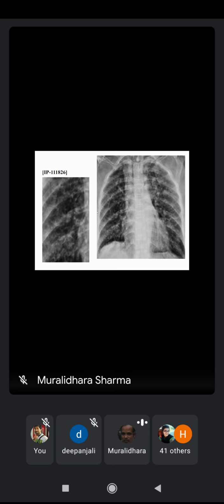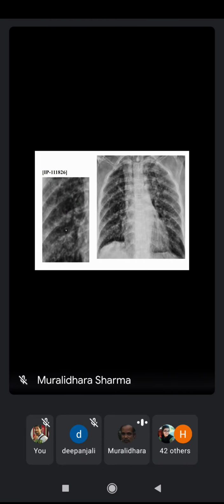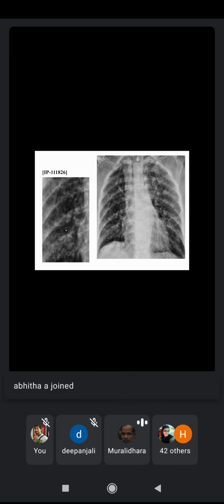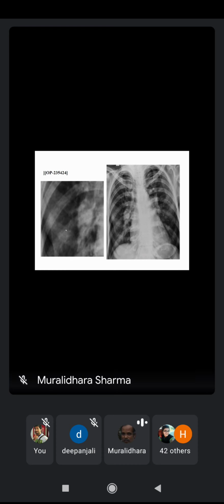But beyond that, if you look at the lung tissue, you can see this dense mottling along with thicker fibrous bands all mixed together. This kind of picture is an advanced interstitial lung disorder, which again doesn't mean a single diagnosis. The cause of the interstitial lung disorder has to be evaluated. Interstitial lung disorder also can present in a fashion where it may not be uniformly involved in the lung tissue. Some areas may be more involved, as in this X-ray.